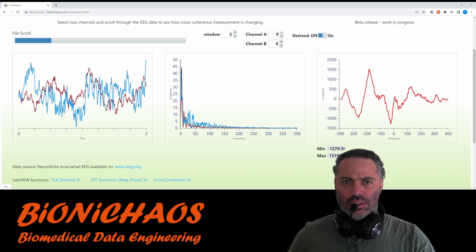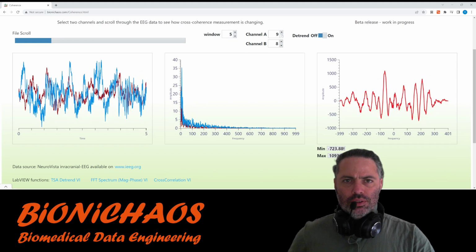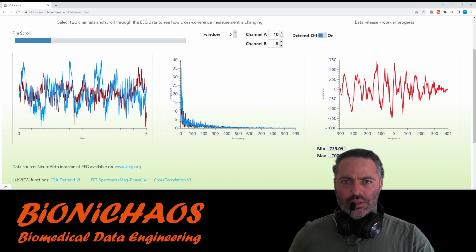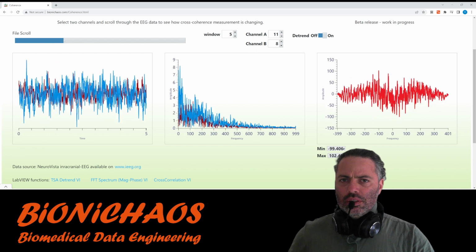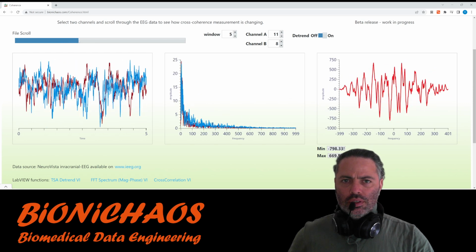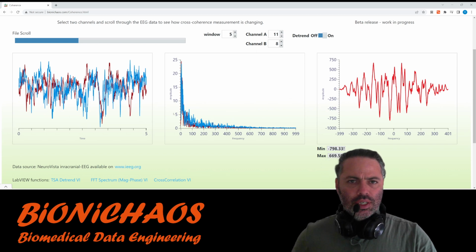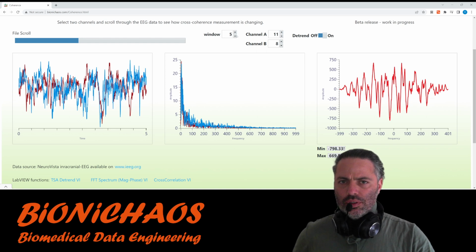So in this case, again, you have this negative peak. Maybe we'll increase the window a bit, just so we can find something more useful. You can see that drop there. That should result in a positive peak here, but there's other things happening as well.